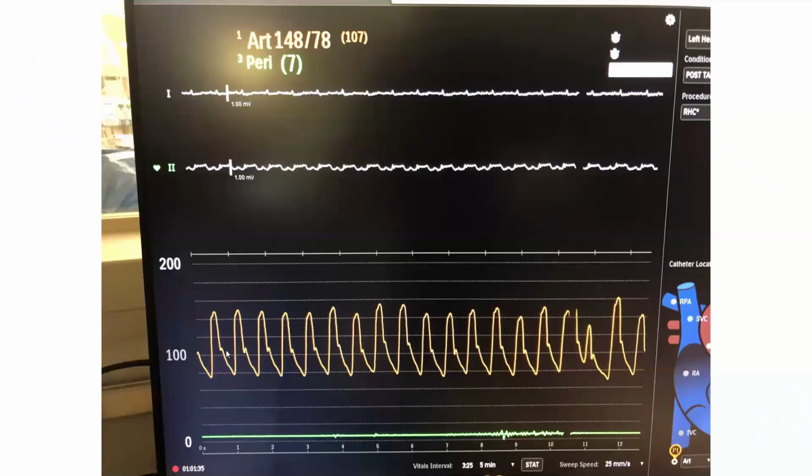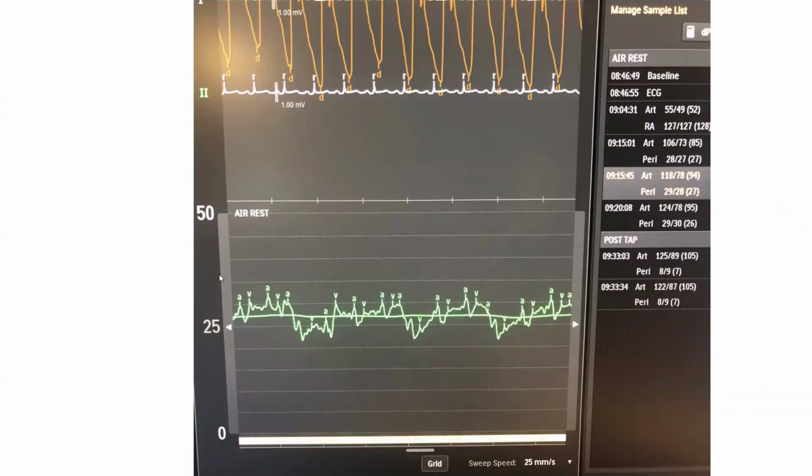And this is the same patient after pericardiocentesis. You have a much larger pressure waveform and stroke volume in all cardiac cycles, and there is a whole lot less respiratory variation. There is no pulsus paradoxus. And this is the pericardial pressure in this patient.